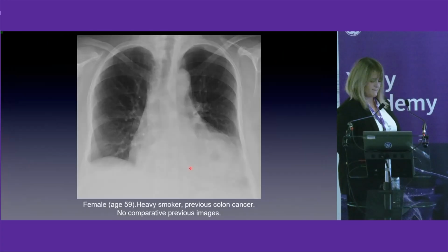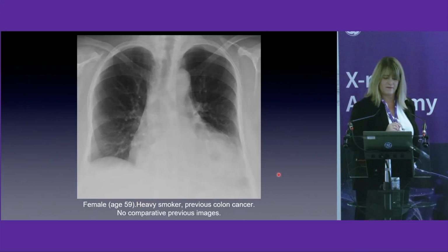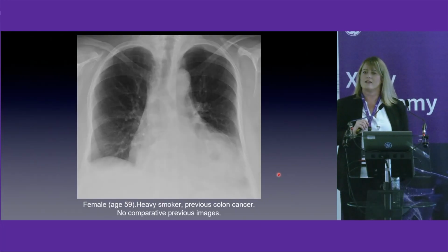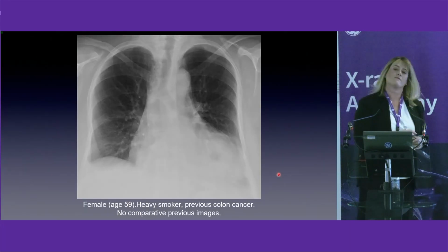What about this? Female, 59 years old, heavy smoker, previous colon cancer, and we do not have any comparative previous image. Anything?